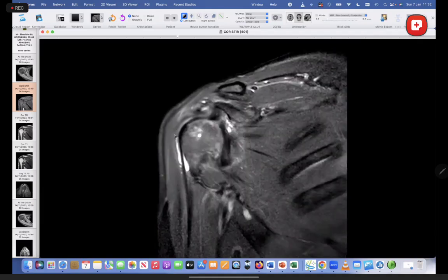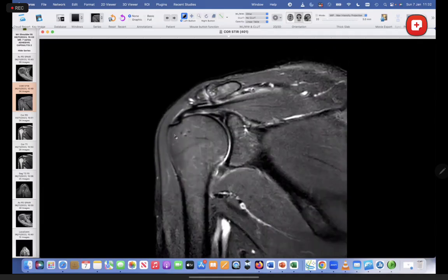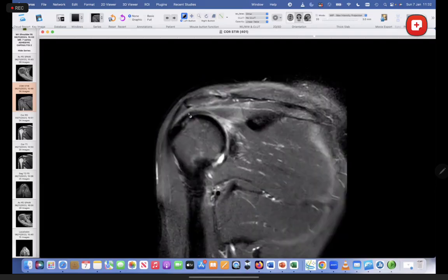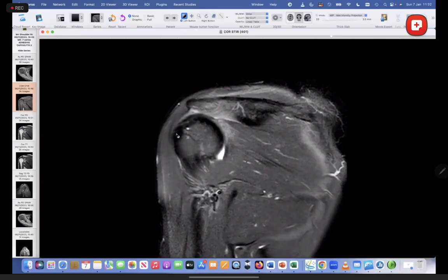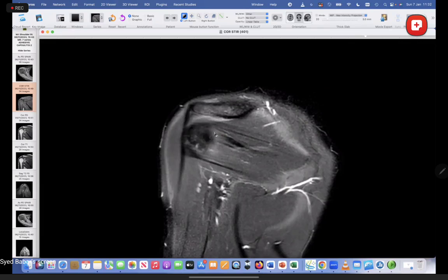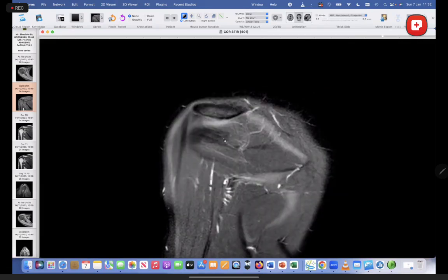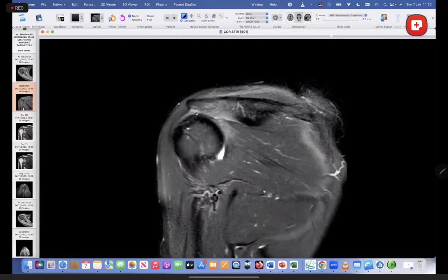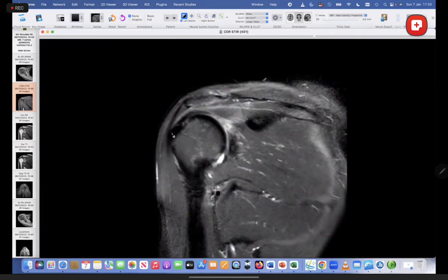Here we're coming forward. So I'm going to start again and go back, back, back, back. Now we are going to hit the infraspinatus. There comes the infraspinatus tendon. This is the infraspinatus tendon. Keep going back, and this is the infraspinatus insertion. And this is the infraspinatus muscle, and this is the tendon starting in the middle, and then it inserts. Remember, it's coming at an angle towards you, so you won't see it in one plane. So you have to slide forwards and backwards in order to see the tendon in its entirety. So this is where the infraspinatus is inserting.